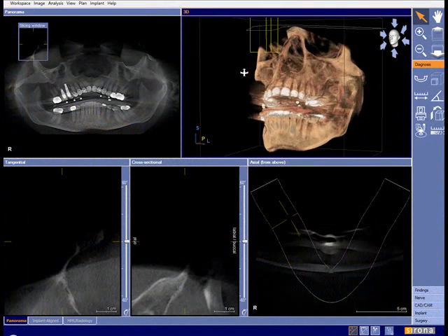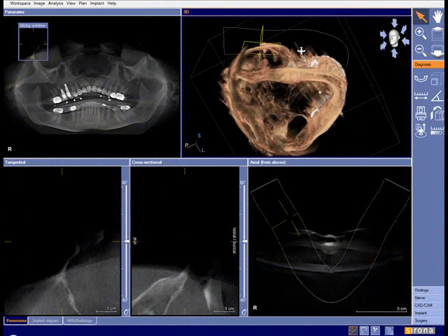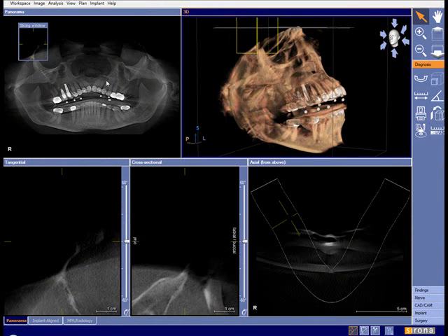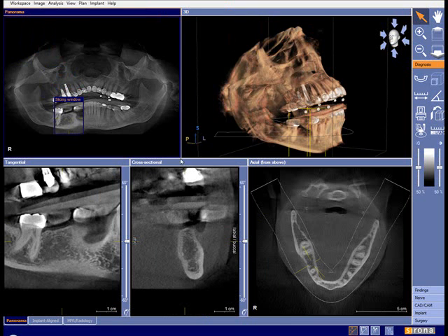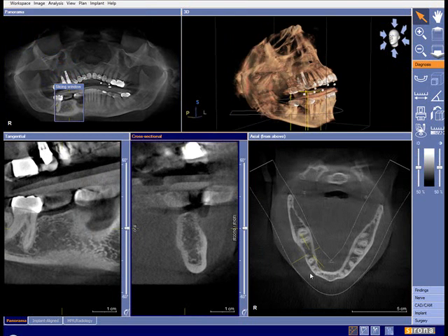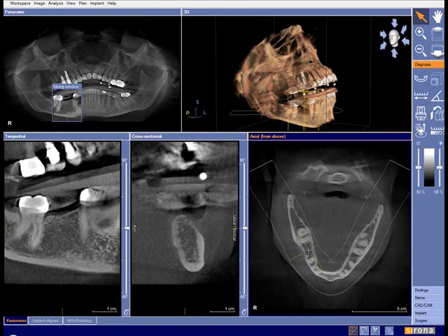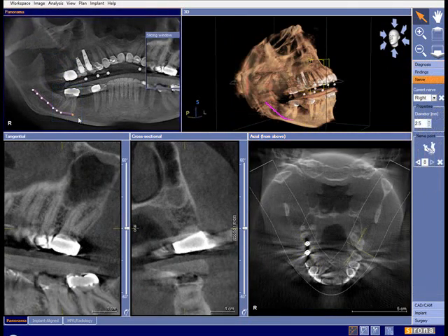We can flip it around, see exactly how thick and tall the bone is, and there's a few things we need to look out for. So primarily I'm concerned about where to place the crown, and the implant has to retrofit to that crown. So we'll take a look at the bone that this patient has in the area where the crown's going to go. We can see how thick the bone is, we can measure it, and a few things we need to be concerned about as practitioners.